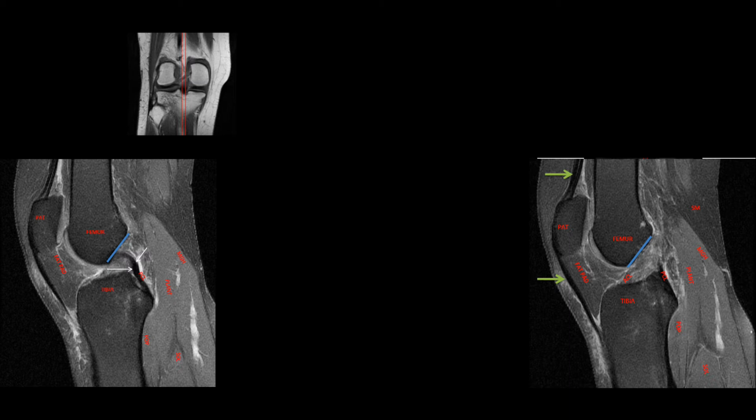So if we were to take a cut right through the middle here of the knee, you can see the femur, the tibia. You can see the fat pad here, the patella, patellar tendon. You can actually see this would be where your ACL would come off of and correspond to, along with your gastroc and soleus muscles down in here. So kind of get an idea of what you're looking at there.